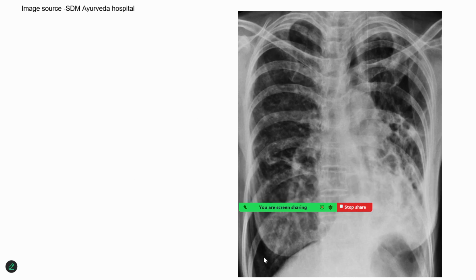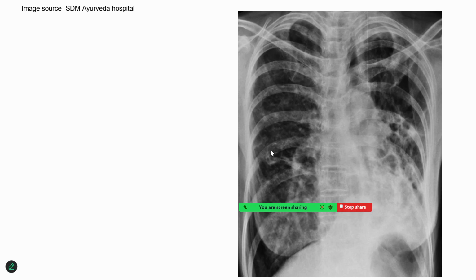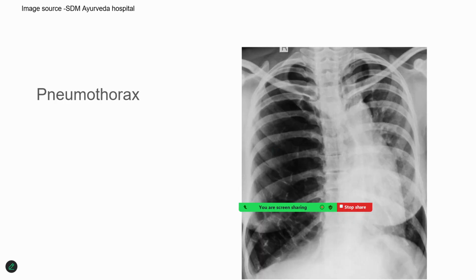Now another more complicated issue, there are emphysematous changes, the fibrosis, atelectasis on the left side, almost all the changes are seen. These kinds of patients do present with a very chronic history as such, and the treatment protocol would be almost the same for all the patients. Of course, the outcome would be poor in such conditions.